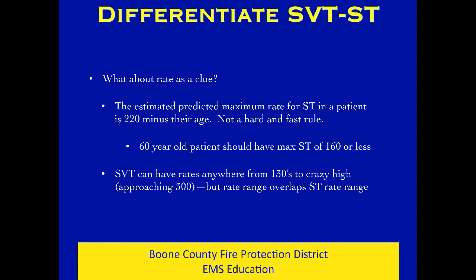Then what about rate? If you're trying to decide between SVT and sinus tach, there's somebody out there always telling you, well, SVT is 160 or more. And so that's sometimes true. In younger patients, that's true. But in older patients, that 160 number is just kind of pulled out of the air. And it made its way into teaching for some reason several years back. I was taught this. But it's been a long time, and things have progressed.